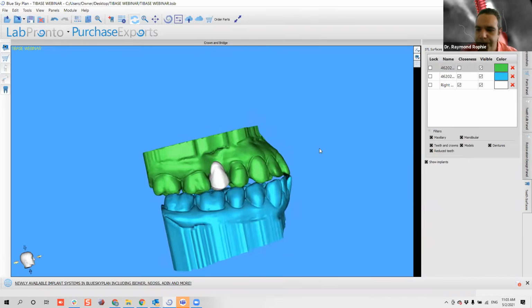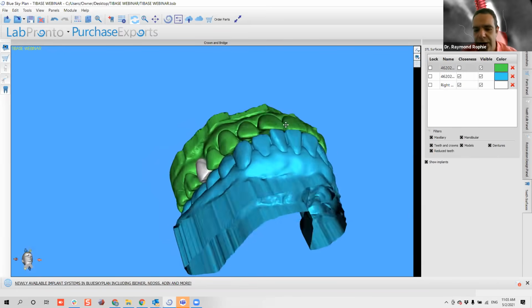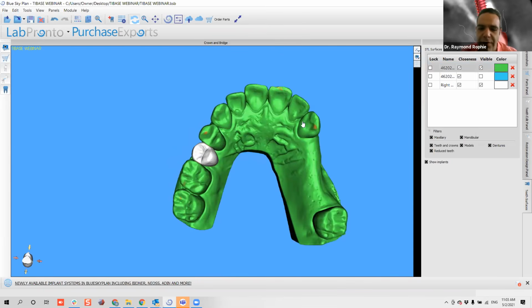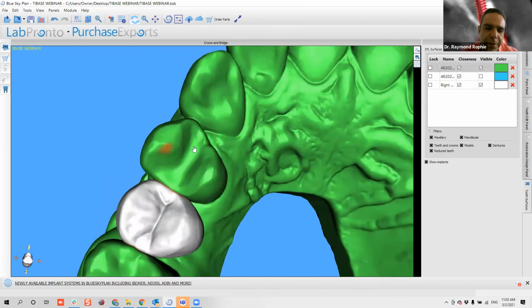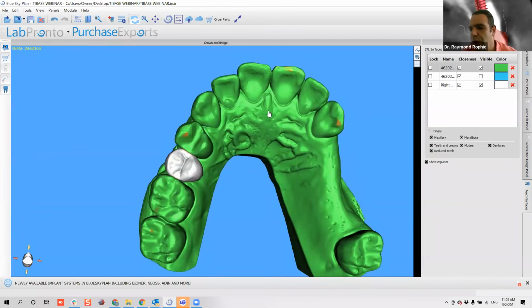And of course, now these models don't have occlusion at some points, but you can just check the visibility, check the closeness for everything, and wherever you have any point, it will turn here. As you can see with a heat map, it will show you with colors where it is closing, where it is actually close or impinging. Okay, good.